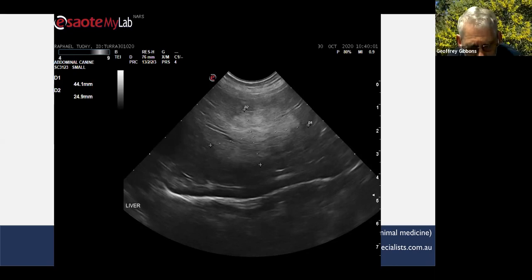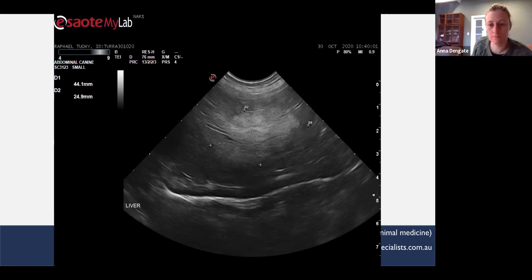So the liver parenchyma is of mixed echogenicity, because there's hypoechoic scattered focal areas through it. And just on the near view, there's some hyperechoic nodules. And the mass has hyperechoic nodules in it as well.